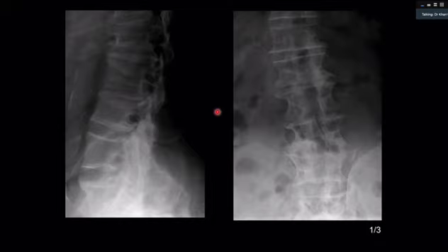Okay, so can I stop you there? So you are considering neurofibromatosis because of the posterior scalloping, fine. But let me give you a hint. Look at the pedicles. So they're thinned, or flattened, rather. Something else. Are they quite widely spaced?